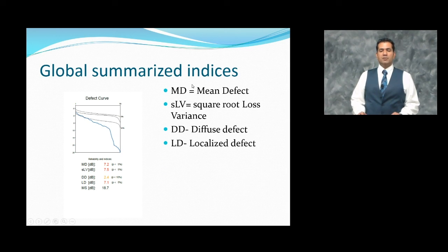The mean defect is a one-number representation of the visual field that says how much defect is present in the visual field. The square root of loss variance says how much of this visual field defect is actually localized, or whether you see a pattern of defect. The bigger the number, the greater the chances of the defect being localized and a pattern being present. There are p-values given next to it, so you would know when they are significant. The diffuse defect is a number representation of the Bebie curve that we are seeing, and if it's significant, the p will be less than 5%, and the localized defect, if the number that we are getting here is significant, will be less than 5%.